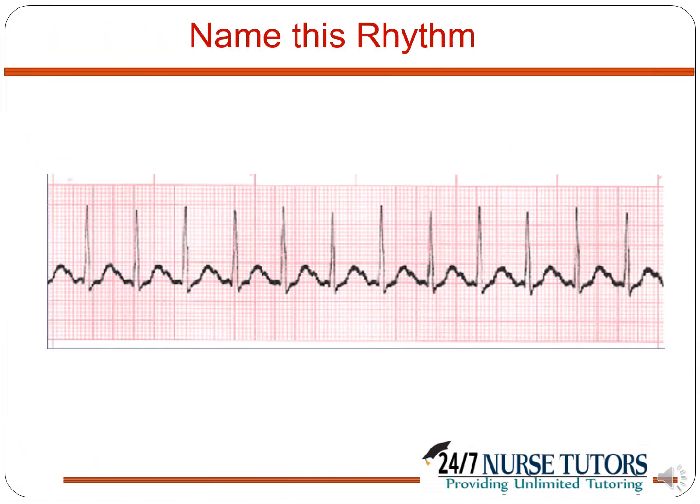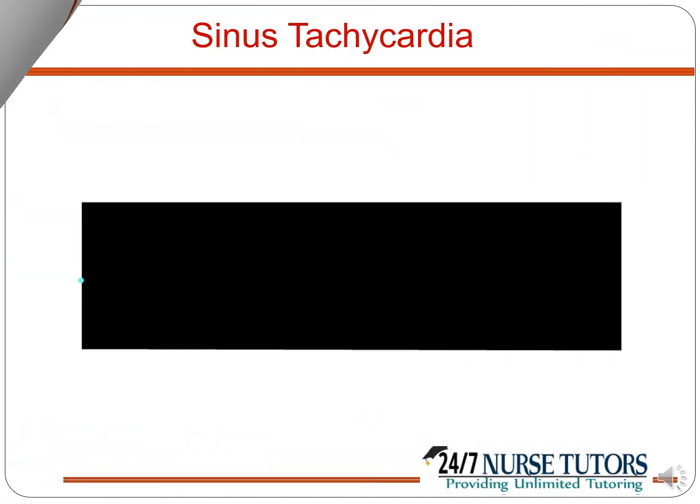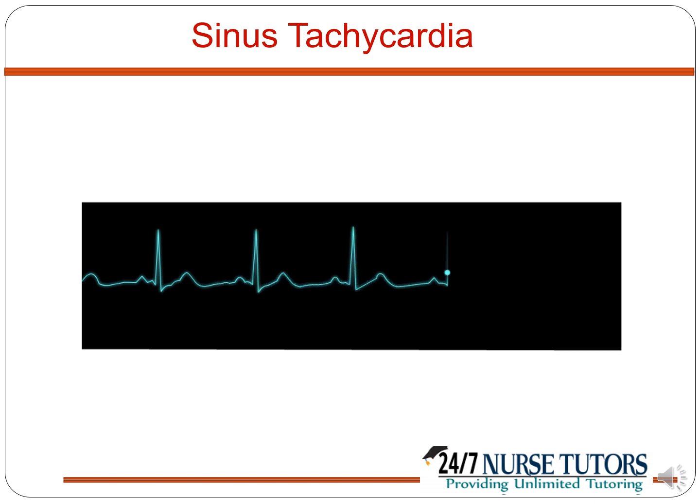What rhythm is this, please? You are seeing sinus tachycardia. Let's talk more about it. Sinus tachycardia is normal except the heart rate is greater than 100 beats per minute. In surgical patients or trauma patients, this is often an indication for fluid replacement.